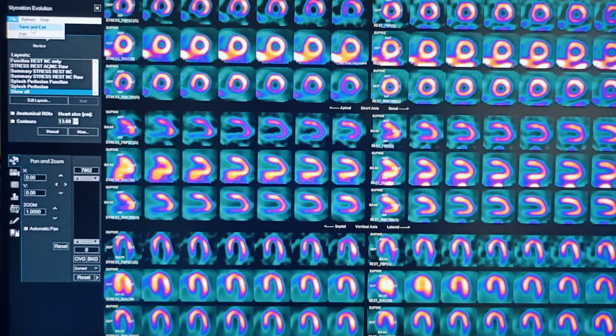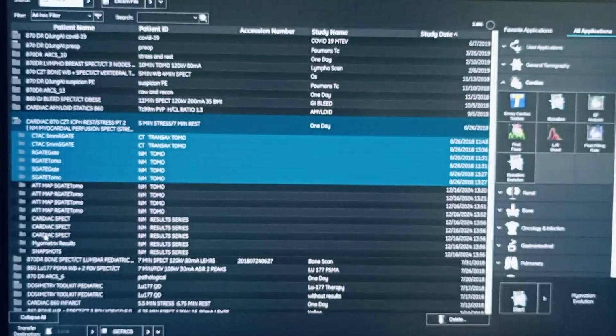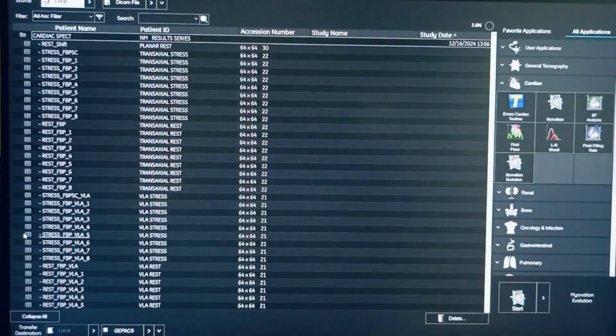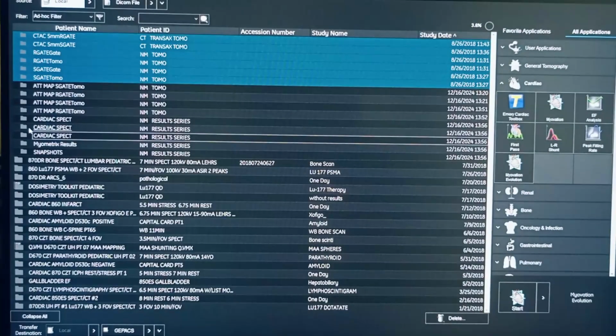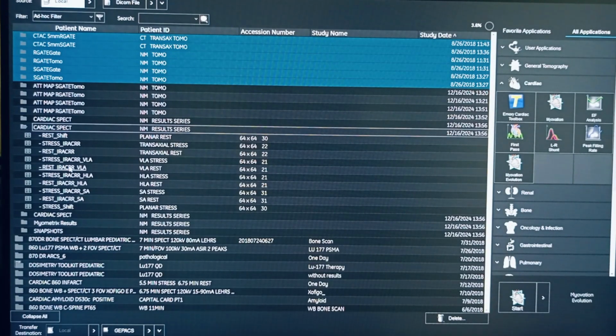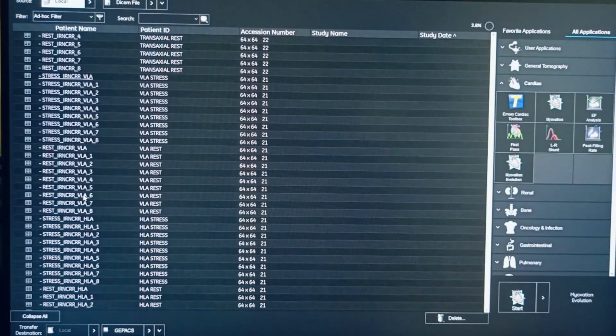So for example, save and exit this. So you will get expect saved results. So this one is filter back projection and this one is AC and this first one was NC.